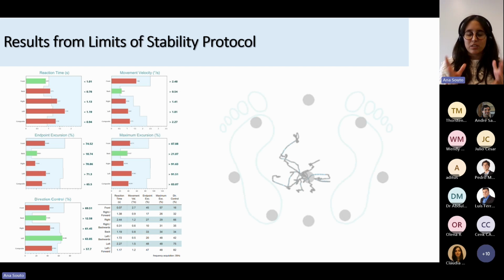And here we can see already that marked asymmetry between the targets at the right and the targets at the left. At the targets at the left, the COP displacement is not good, but at the right there's almost no displacement. So this person is incapable of moving his or her body towards the target at the right.